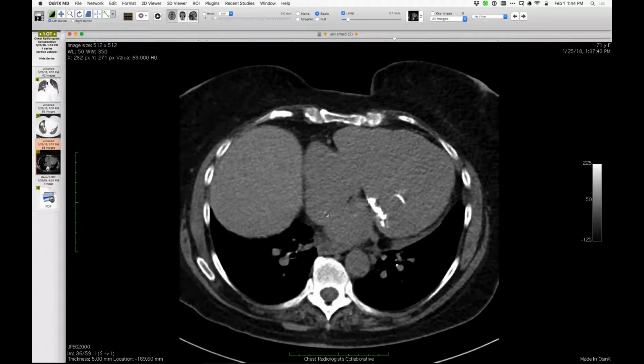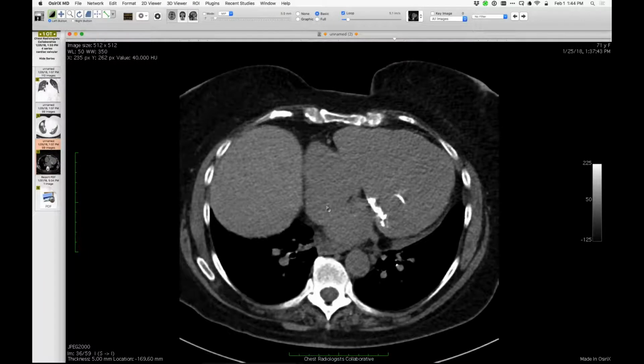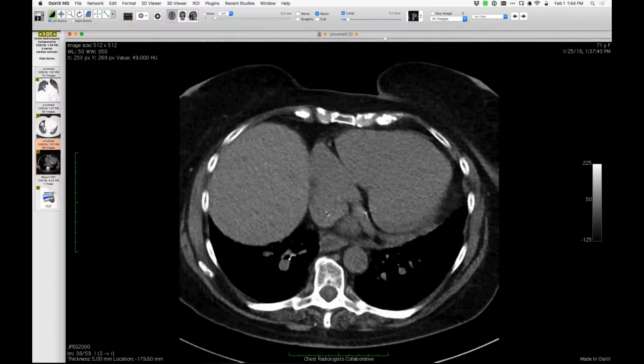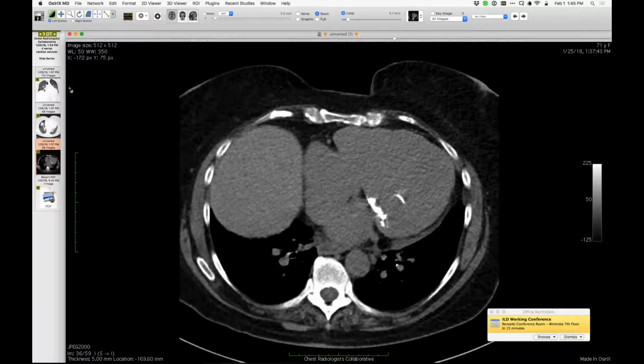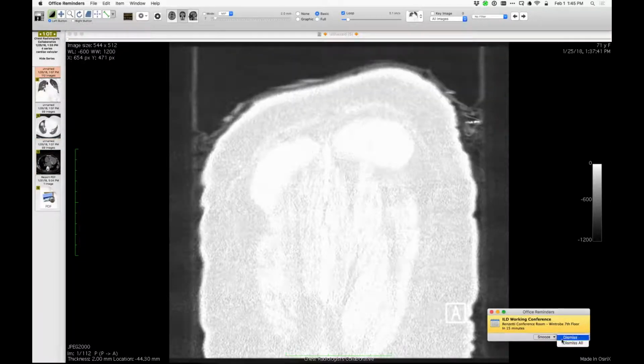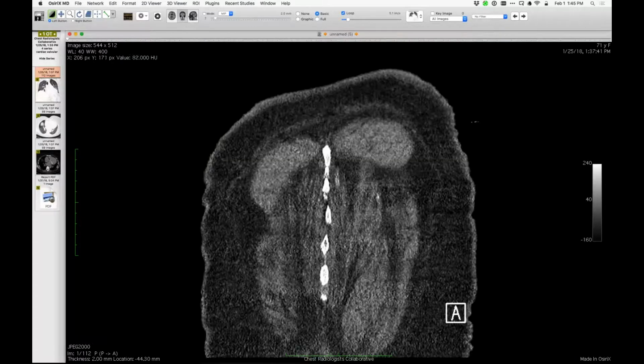And then I got to thinking whether I maybe have seen this before, but it didn't register. So how often do you folks see or register calcifications, not just in the annulus, but even in the mitral valve leaflet in elderly people? And I think some of it's extending into the chordae as well. And that may be what you're seeing, projecting more into the lumen. And I know it's come up on questions of foreign bodies. Like there was one case when I was at Grady that somebody thought they had gotten shot in the heart because there was something in the LV, but it was just chordae calcification.